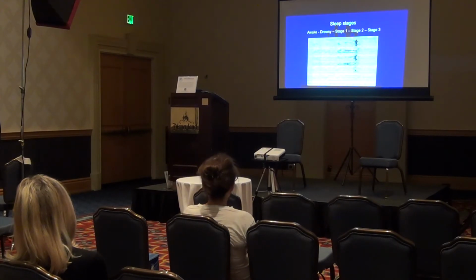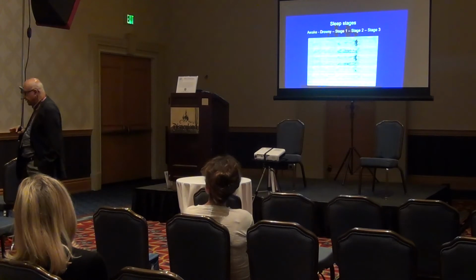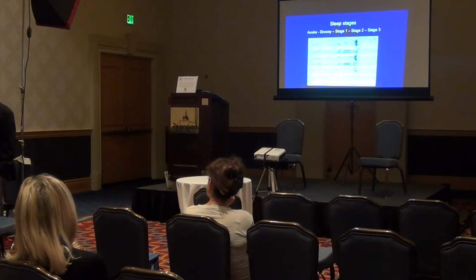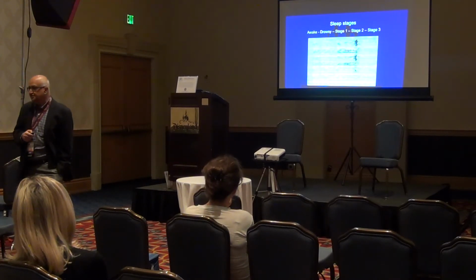It's not for the parents or the family members to try to interpret, because every once in a while I come in the morning and I realize the parent didn't even document seizures that were going on. They never saw the baby. They were fixated on the monitor. And then they were marking all those things, because right here, see that? That looks really busy, doesn't it?